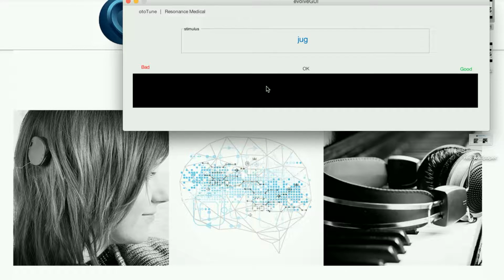Okay, it sounded a bit tinny, so we can put that here. Okay, I like that one quite a bit more. That one, yeah, I like that one as well. That one is pretty similar to these, but maybe a little bit worse. Ooh, that one was way too bassy, I'd say, so I'm going to put that one down here. That one was pretty good, but I didn't like it quite as much as these three. And that one wasn't very good. That was okay.